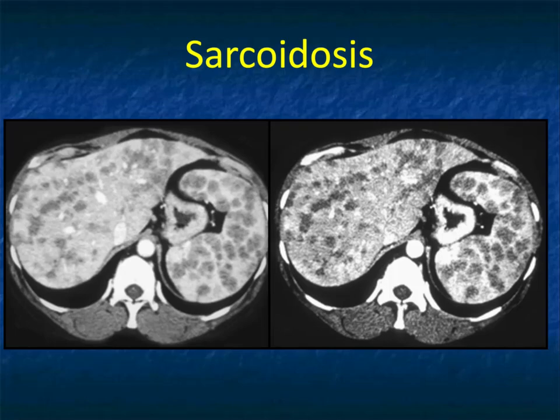A patient has a CT scan for, let's say, trauma, usually a 30-ish-year-old female who's always the sister of a doctor, often a radiologist. And they read this as lymphoma. And the truth is, without a history or anything, this could be lymphoma, multiple low-density lesions in the liver and spleen. But the patient is asymptomatic. If these were abscesses, that's a second thought, the patient would be very, very sick. It's not abscesses. This is sarcoidosis.